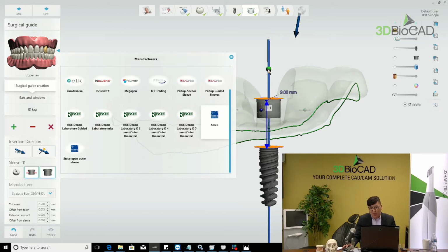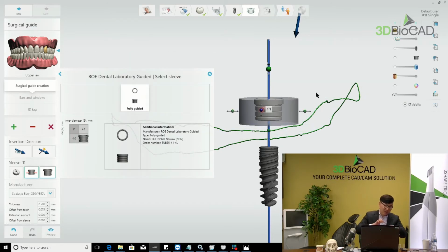So the reason why sometimes we have to change the sleeve height is, let me say the implant is so deep, the patient has thick gum tissue, and the sleeve's bottom can push the gum tissue too much. So if you have that issue, just use that tool, bring it up. But we should let the doctor know, okay?